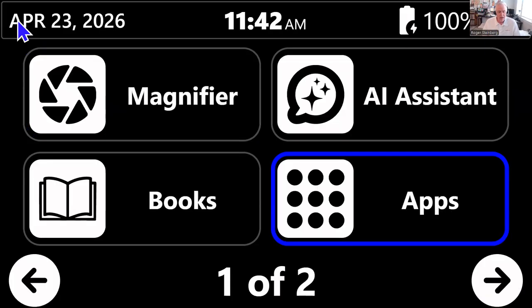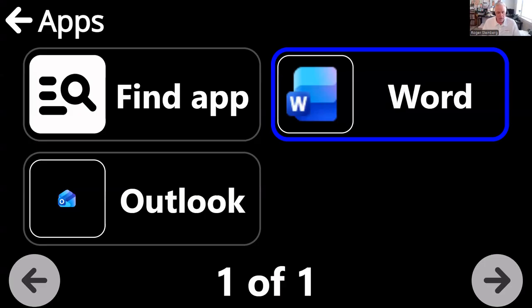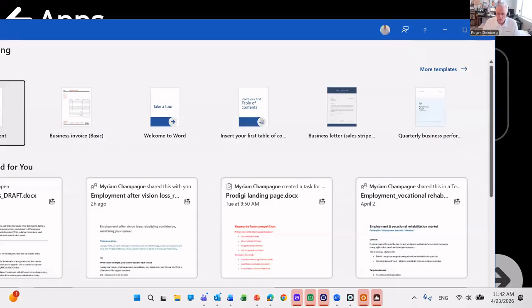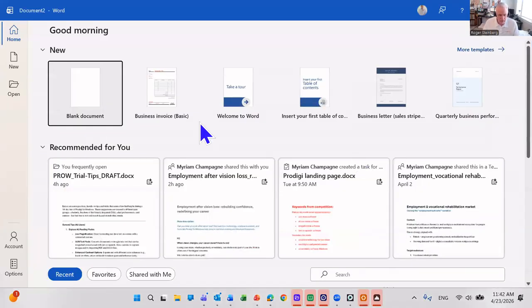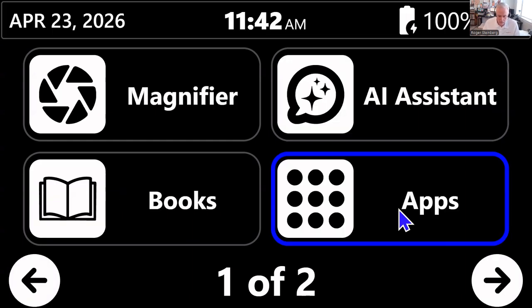So tap that back arrow on the upper left. Again, apps now. I don't have my Windows mode on. Quick access by clicking there and saying, take me to Word. Click on that. It's going to open up a new instance of Word and let me get going with a new Word document when I open it up directly from that apps application. So again, to increase productivity within the Windows environment, we've added this apps application for users to utilize. Okay.